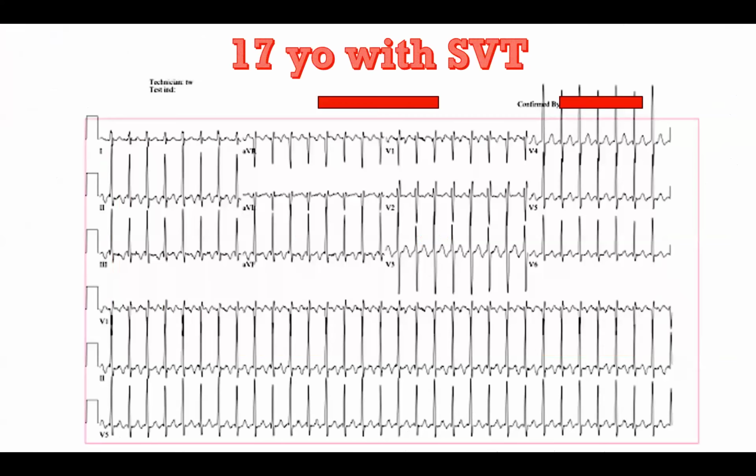Right. This is an ECG that I received via fax. This is real world, because the tracing quality is lousy since we're looking at a faxed copy. I scanned it at the highest resolution I could. The question for you is, do you have any idea regarding the mechanism of this tachycardia? We don't even have little boxes on this tracing, so you'll have to take my word that this is a heart rate of 190, for the sake of conversation.